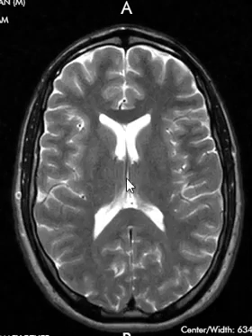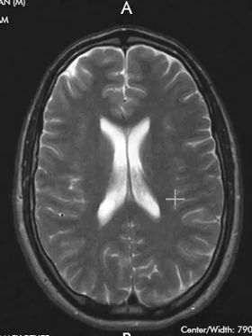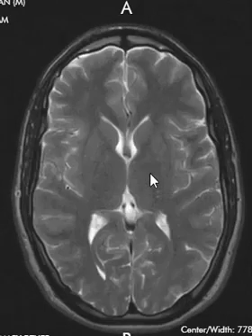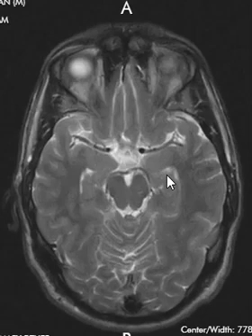We see these longitudinal slits. These are the ventricles, and they're filled with fluid. And we look at the ventricles and see, are they normal in size? Are they shifted from right to left? When they're enlarged, we call that hydrocephalus. But the ventricles are nice normal in size. There's no hydrocephalus. And we come down here.